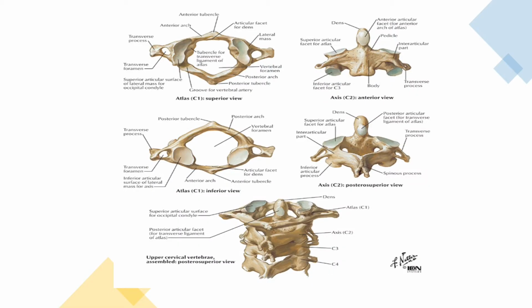The cervical spine, as you know, the C1 and C2. As shown here, this is the C1 vertebra. You know there is an anterior arch, anterior tubercle. Then you have the posterior arch and posterior tubercle. So this is the superior view of the C1 vertebra, or the atlas. And you can see the joint here with the transverse process there, the transverse foramen where your vertebral artery traverses.